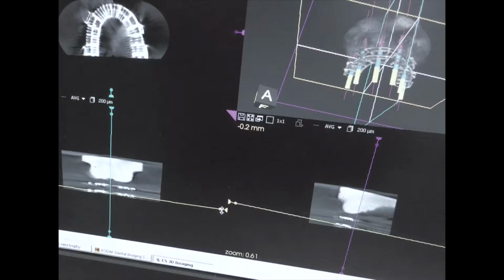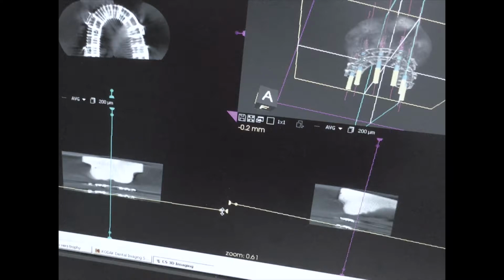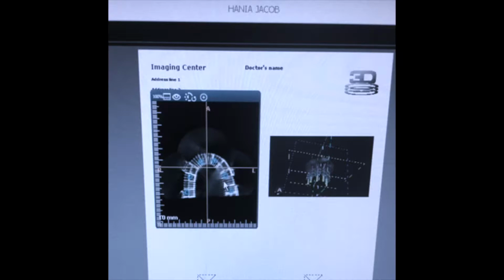Example of an axial view passing through one of the grills where the points of the implant axes are identified by the centre of the blue circles. These views are then printed off to aid interpretation.